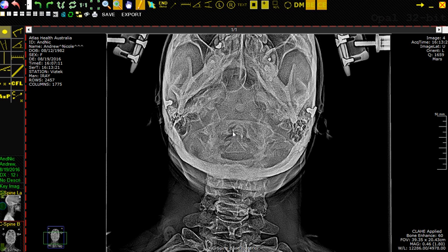The first one is what we call anterior point 1, and it's the interface on the inside of the atlas and basically the anterior, the front side here, where it intersects between the rim of the skull and the C1 vertebra, and it's usually where you can see it slightly dark here. It's the biggest spot off to the side here and side here. So this one here we're going to call anterior point 1, and this is one of the first spots that we need to identify.